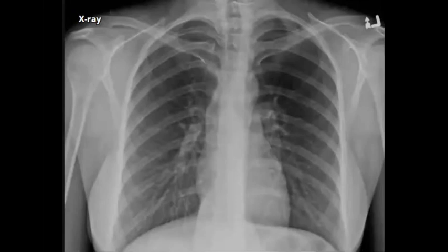So you'll activate your checklist, check for costophrenic angles, and so on. Nice. So Dr. Abbas will be our big star, first star today. So we check for a posterior lesion in the rib. Are you sure it's in the rib? You are very near, but it's not in the rib. Posterior, yes, I agree with posterior, but which posterior?